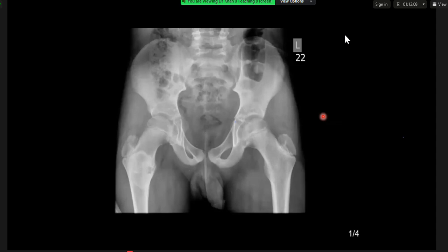I think I would be specifically concerned about this lesion if the patient presented with pain. In terms of the likely etiology, I think it has appearances consistent with fibrous dysplasia, in which case I would like to assess whether there were clinical reasons to suspect polyostotic disease and image other areas of the skeleton accordingly.